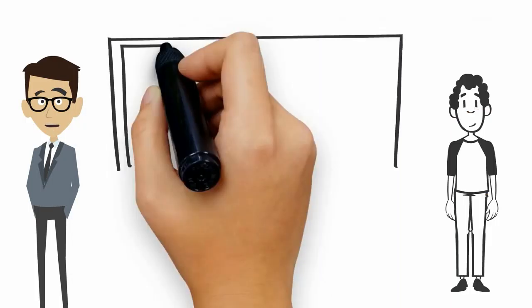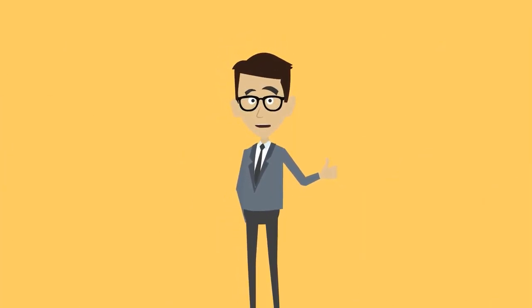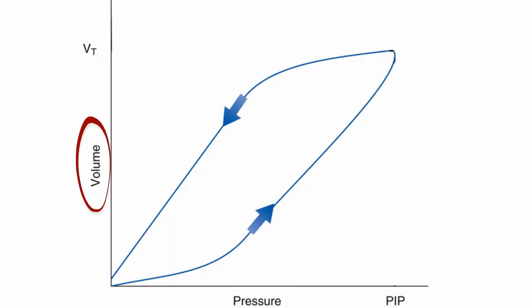So here you are trying to learn about ventilator graphics, and it's just not sinking in. Well, good news! I'll simplify it and explain the importance of checking out ventilator graphics. First, let's start with the pressure volume graph.